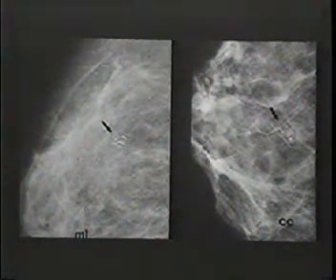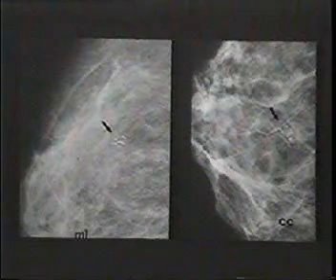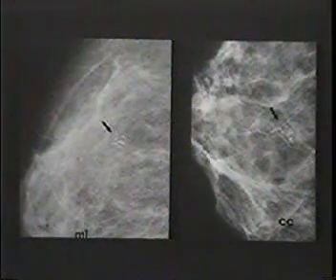But since milk of calcium arises in the same location in the breast as most breast carcinomas do, and that's at the terminal duct lobular unit, it is important to scout the area carefully to make sure there are no other calcifications that might be malignant. If they all look like this, however, a biopsy is not necessary.